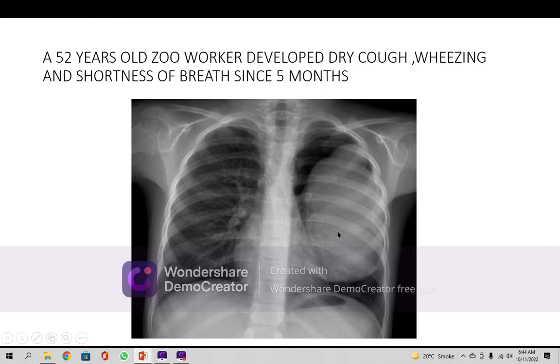Now this is the differential diagnosis you will make, because the border of the heart is visible. Look, the left border is touching it, but the border can be differentiated. The right border is visible very clearly. The upper part of the mediastinum is normal, and there is no pushing effect of this so big mass. So the heart is not pushed, and even the trachea is not deviated toward the other side. Interesting situation. So big mass, and the patient is not very symptomatic.